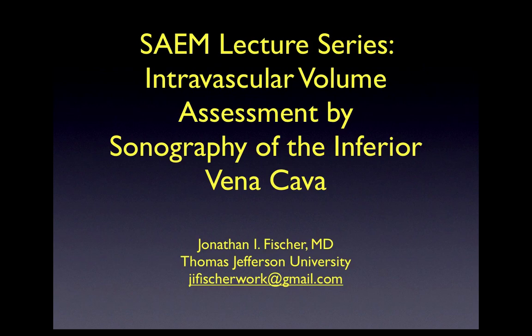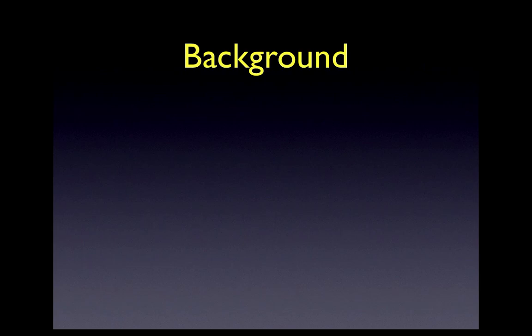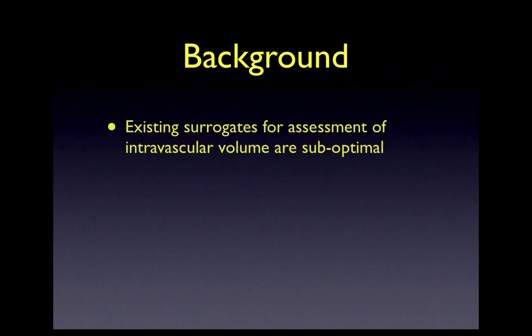Today I'm going to be discussing intravascular volume assessment by sonography of the inferior vena cava. In clinical medicine, determining a patient's intravascular volume status can really be an integral part of a patient's evaluation. This is particularly so in critically ill patients. Unfortunately, existing techniques for evaluating intravascular volume are suboptimal.